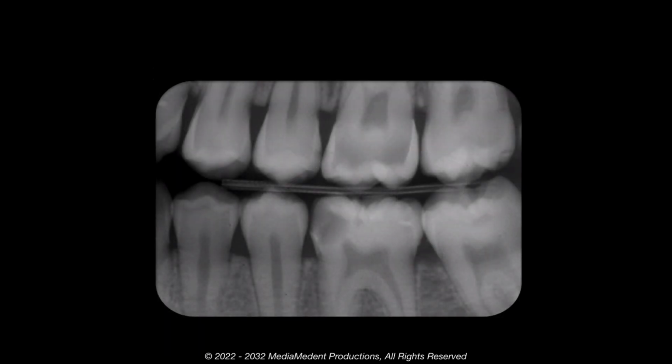The image of cervical burnout is often mistaken for root caries because of their location. Cervical burnout, an area of relative radiolucency, is an artifact that appears in dentin between that part of the tooth covered by alveolar bone and that part of the crown covered by enamel.